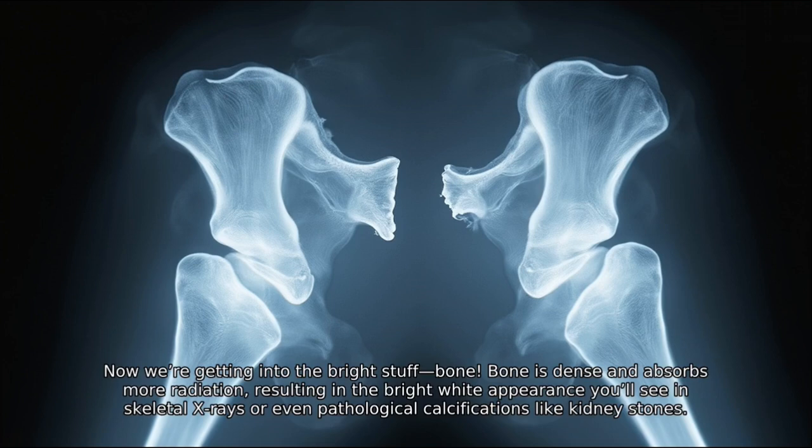Bone. Bone is dense and absorbs more radiation, resulting in the bright white appearance you'll see in skeletal X-rays or even pathological calcifications like kidney stones.